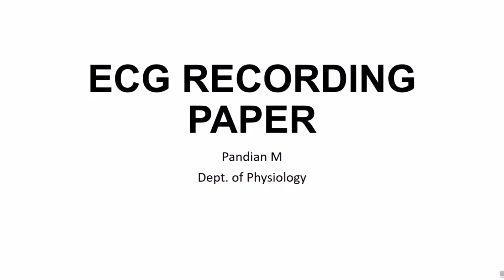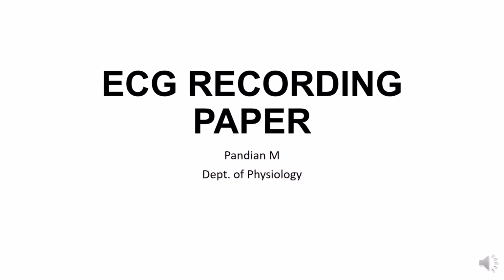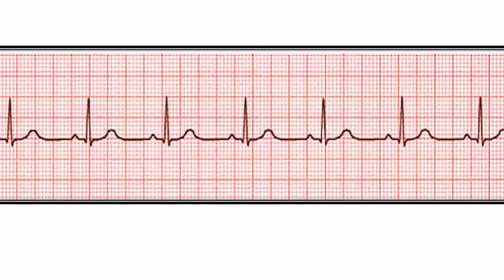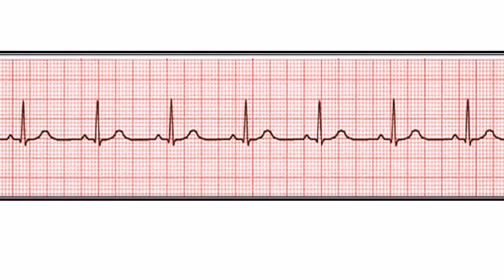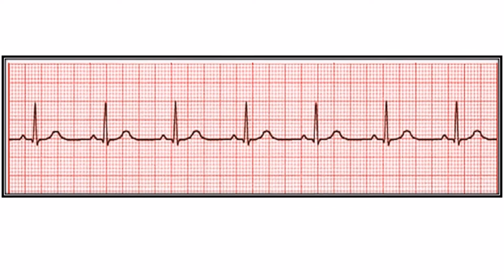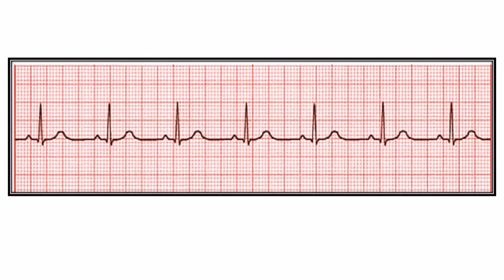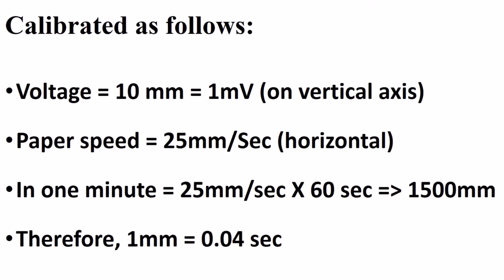In this video, we are going to see about ECG reading paper and the calibration. This is the paper with reading. We will see certain important things about the paper and how this will be useful for reading the ECG graph. Calibration of the paper is as follows.